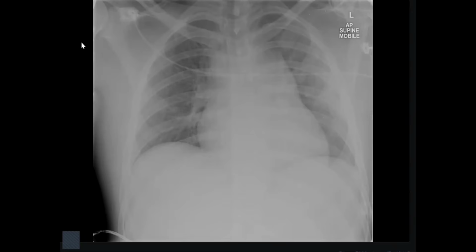I am provided with a frontal chest radiograph in supine position for a patient who came from a motor accident trauma. I'm looking at the lungs in the bilateral apical region. I see the absence of vascular markings. I want to see for any visceral edge.